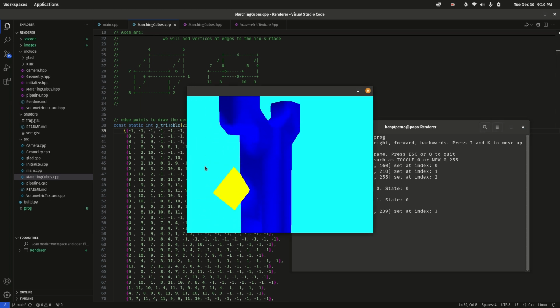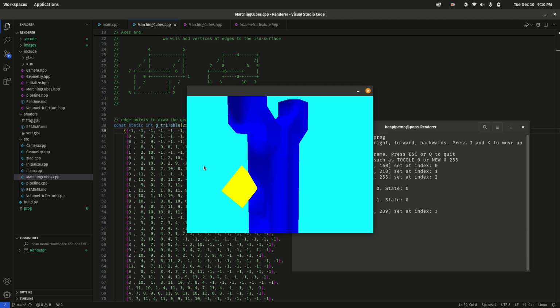Just as we suspected, there is something in there that doesn't quite match some of the other surrounding tissue. This is an example of some of the great techniques that you can use in medical imaging to help doctors and surgeons better understand the patients that they're working with for more precise surgeries and so on.